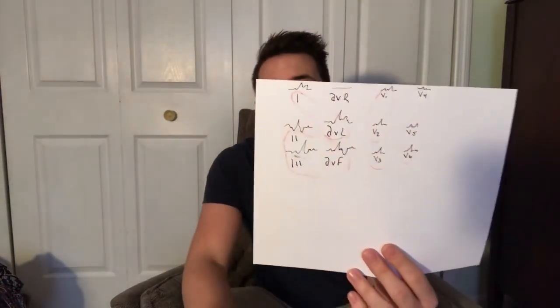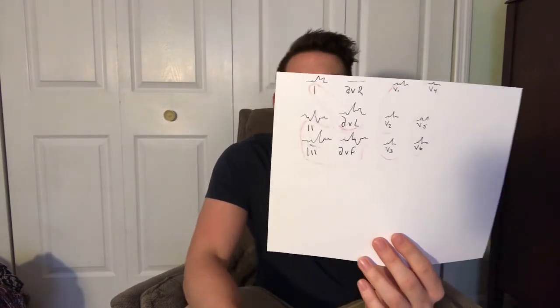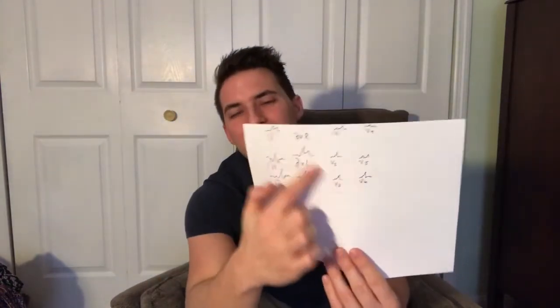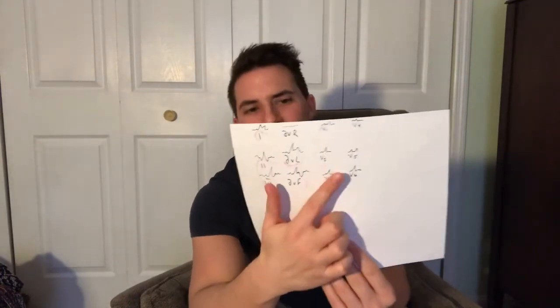So I want to show one more paper, the one that I want to stress because I do feel it's important for identifying and knowing. We're looking at ST elevation or depression at the J point, and it needs to be in 2 contiguous leads. So what does that mean? It's just a big word for saying it needs to be in 2 leads of the same place, same areas that we're looking at. But we already know these leads, right?